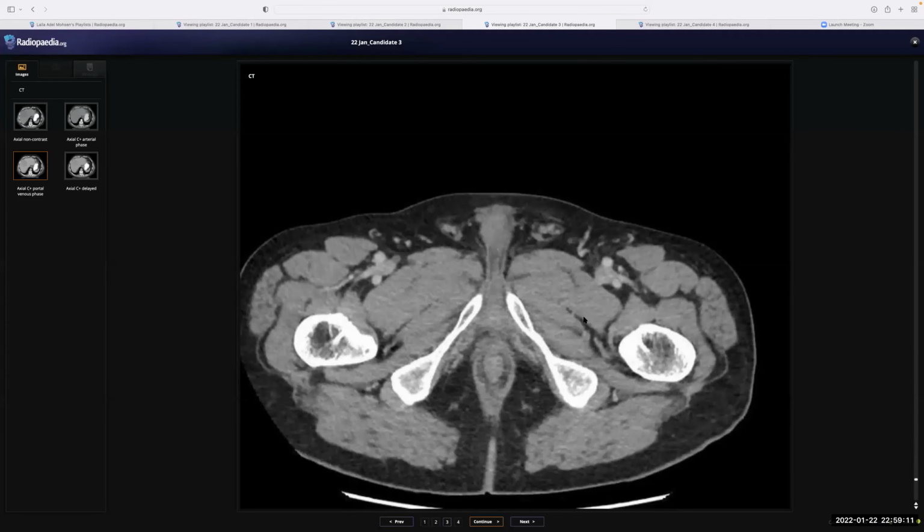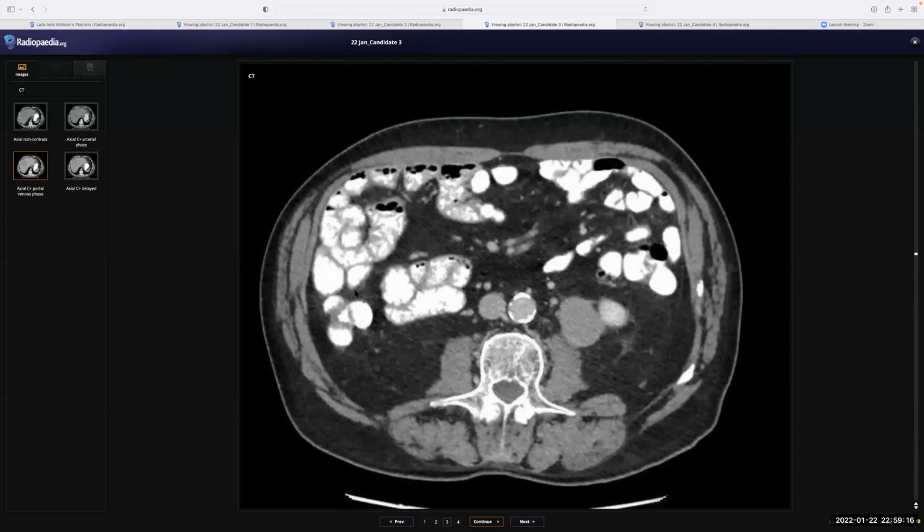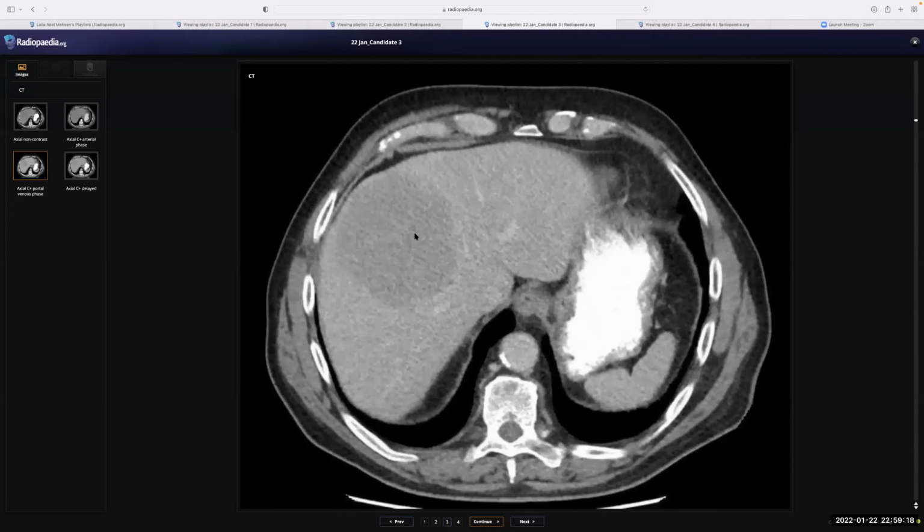Okay. So this is a case of lymphoma. So this was lymphatic tissue, and this was a hepatic lymphoma as well. Of course, we cannot tell this on CT, but we would say that this is a lesion. This is solid. It cannot be hepatocellular carcinoma, like you said, and we need a guided biopsy for this lesion. Okay, thank you. I have never seen such a case.